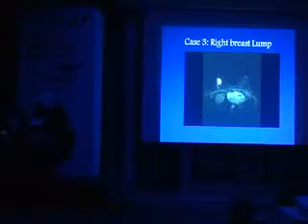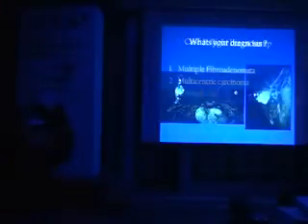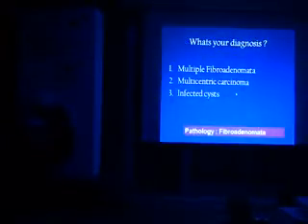Yes, there are non-enhancing internal septations that are characteristic of fibroadenoma. So if you can recognize these internal septations and they are really non-enhancing, this is a fibroadenoma. So please, always look for these internal septations. So the diagnosis is actually multiple fibroadenoma.